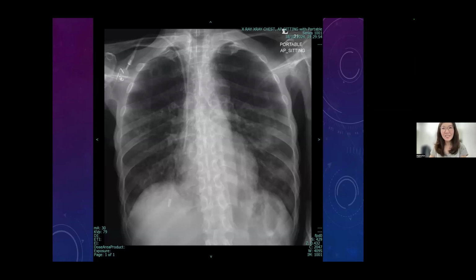Okay, good. So remember lines, whenever we see the lines, either internally put or external artifact, we will try to figure out the lines first. Then only we go to the lung field so that we won't miss out. If we just look at one glance and then we don't see it clearly, outlining it one by one, we may miss it actually, correct? We will think it's quite okay, but then we miss it. It is malposition.